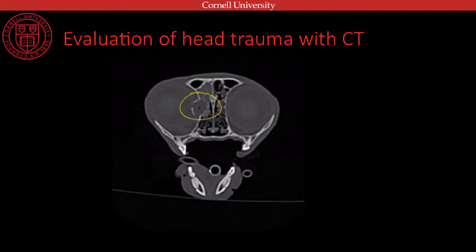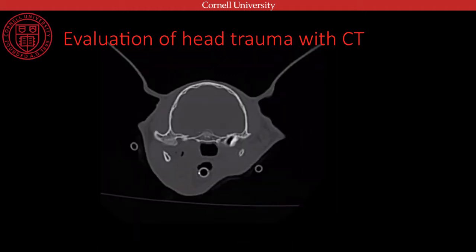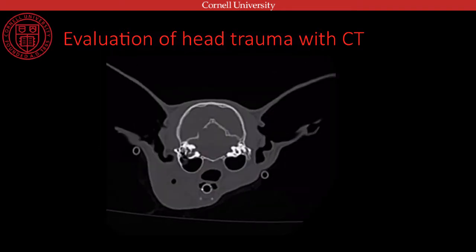This is her eye. The eye's displaced laterally as a result of it, and there's a few little fractures. It's now sitting right at the base of the orbit here. If we look at the other side, we're going to have ocular muscles and an optic nerve coming past right there. It narrowly misses her bulla, comes out between her bulla and her mandibular ramus here. And this is her pharynx sitting there. And then we are under the bulla. This is a normal bulla here.